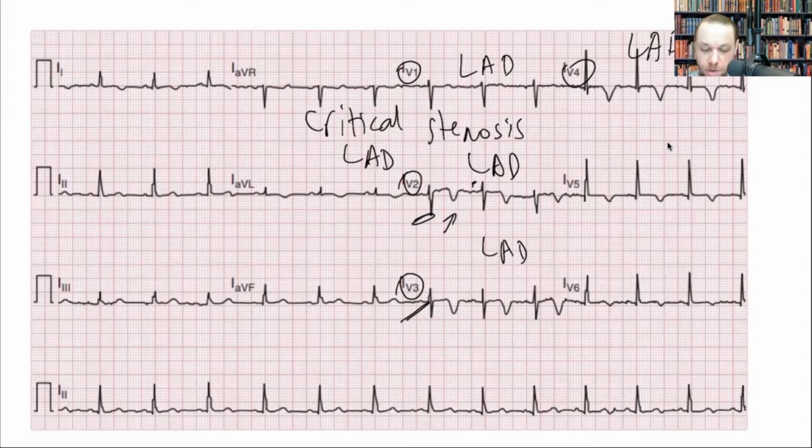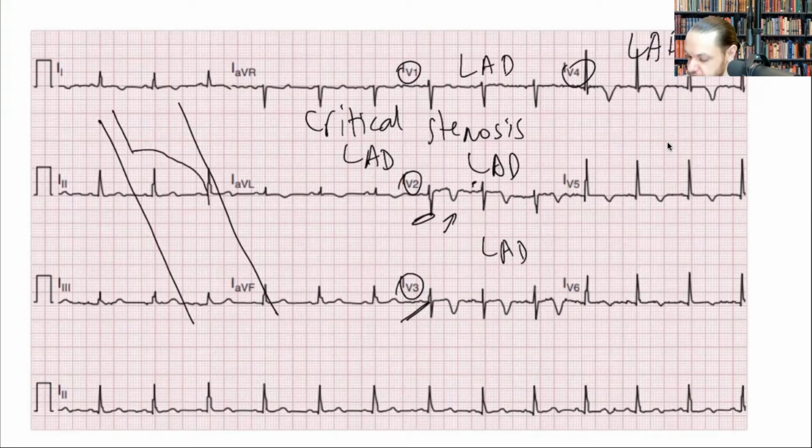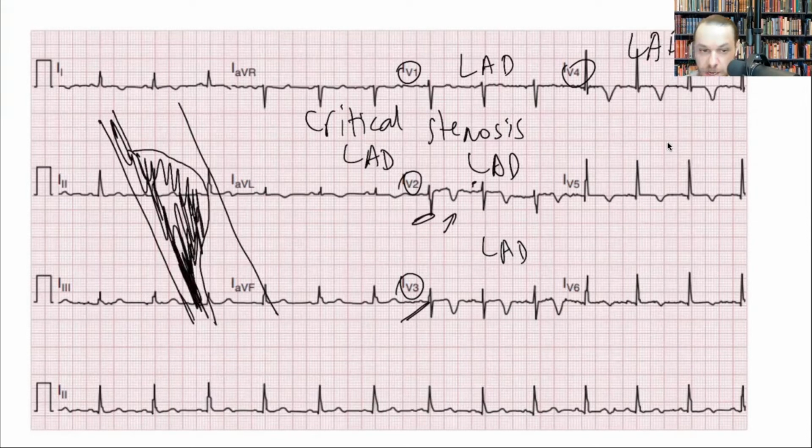So usually, based on the literature that I have, it's basically patients with unstable angina, and as we know, patients with unstable angina don't yet have cardiac biomarkers in blood. They have chest pain that's prolonged for 20 minutes. It may resolve, but you may see this type of pattern on ECG. What this signifies is that, let's say this is your coronary artery, right? This is your vessel, they may have very significant or critical stenosis, meaning in a matter of days or weeks or maybe a month, they will have a full-blown MI, right, involving the LAD wall.